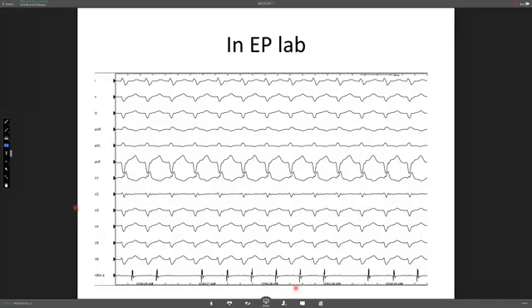There's a question, Khalid, about why fascicular VT. Yes. Essentially this is why most algorithms are so difficult and cannot be accurate, because I've chosen here a fascicular VT. We know fascicular VT originates from the fascicle. So it's not the typical VT that you see arising from the ventricular myocardium. And this is why fascicular VT has a property related to the conduction system, the His-Purkinje system.